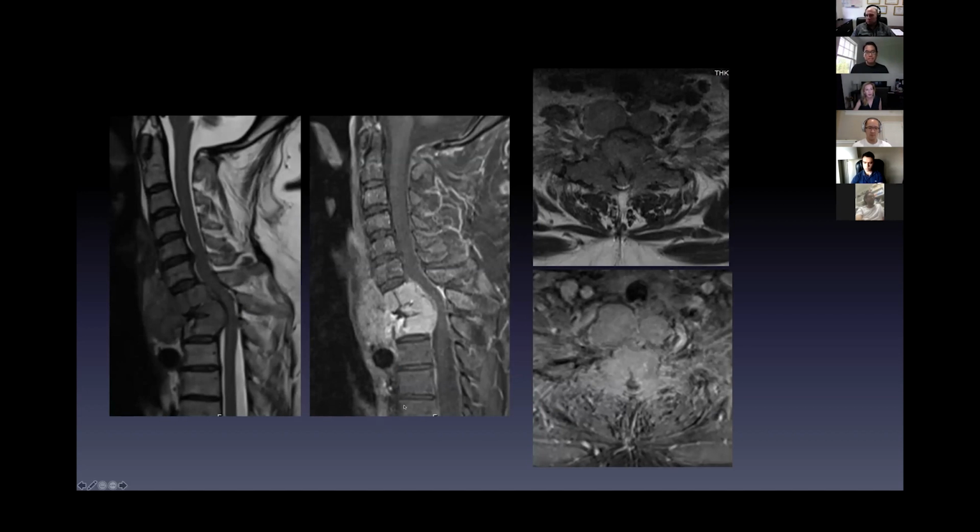Well, whenever I'm looking at tumor cases, and hopefully I'm answering your question here, I look at the bones first, like I said: alignment, what's involved. Is it going into the canal? So the bones and alignment are first, the canal is second. What's it doing to the cord? Is it compressing the cord? Cord signal is third. I obviously don't have all the series and images up here because there's not enough room, and this was just a quick preview case. But so: epidural disease, compression of the cord, intrinsic cord signal.